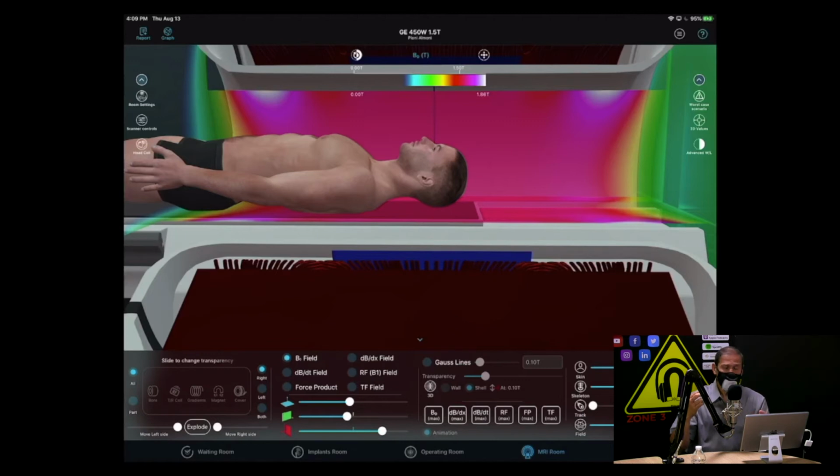If you look at the center, you see how red the center is? That's very homogeneous. Does that make sense? Yeah. It has to be, because as you guys know, we need a homogeneous magnetic field in order to do MRI. Otherwise, you're going to get all kinds of artifacts. So we go to great lengths to provide a very homogeneous magnetic field in the center of the bore. But if it's homogeneous, that means there's no difference: dB/dx, the difference in field here versus here, is essentially 0.